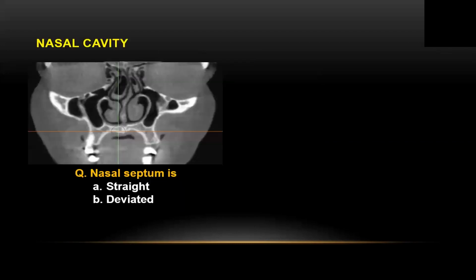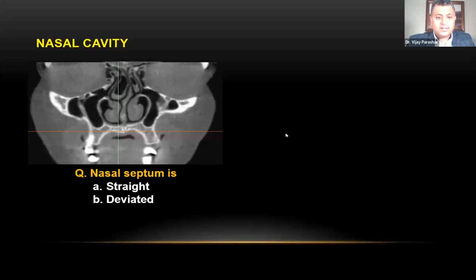So let's take a look at this one real quick, since you guys are doing so awesome and using the Q&A. What do you guys think? The nasal septum, is it straight or deviated? Okay, beautiful. So this one, Dr. Vadviker.